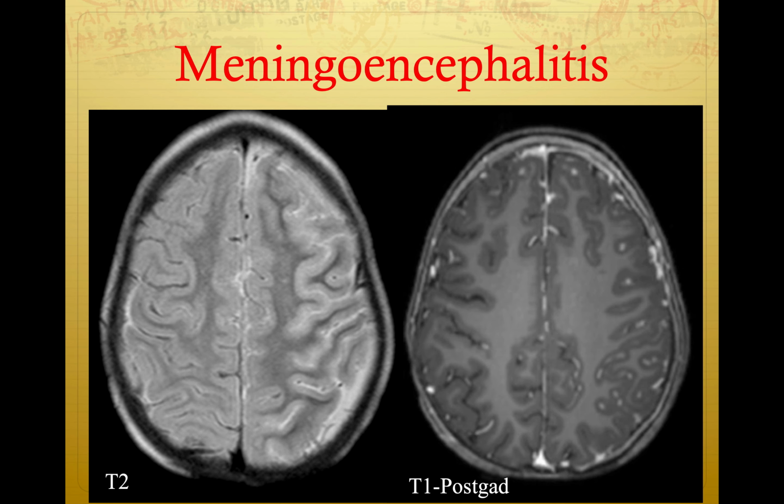Again, I showed that MRI is very, very good at characterizing cases related to meningoencephalitis. Again, like the leptomeningeal enhancement that I showed you earlier.